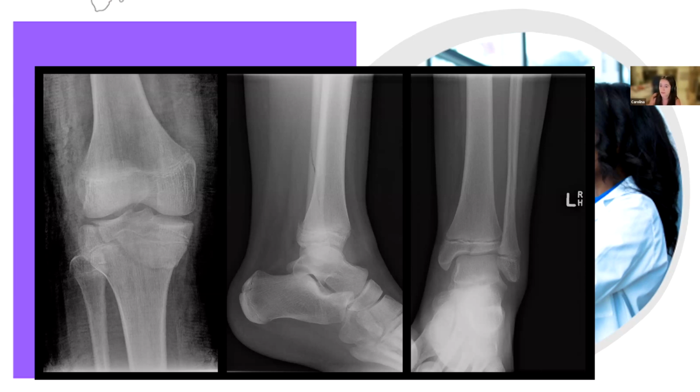What you see is a vertical fracture through the epiphysis, a fracture through that open aspect of the tibial physis, and an oblique fracture through the metaphysis. This is what we call a triplane or triplanar fracture.